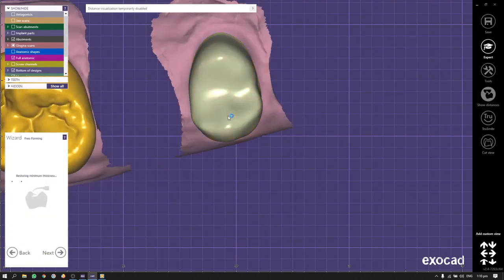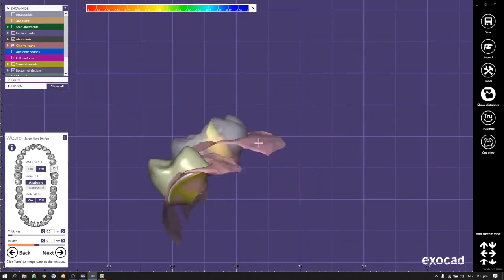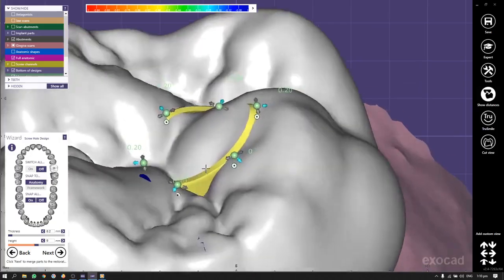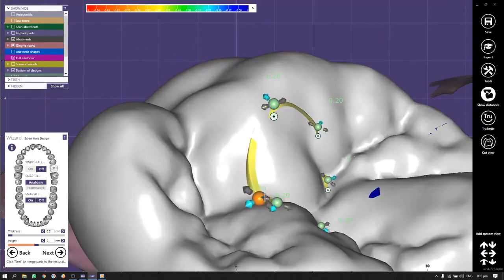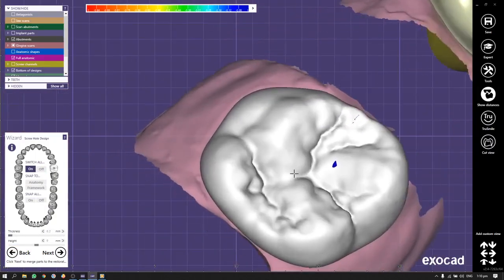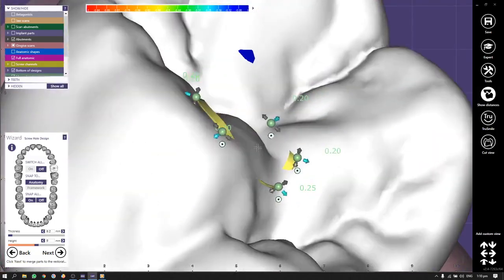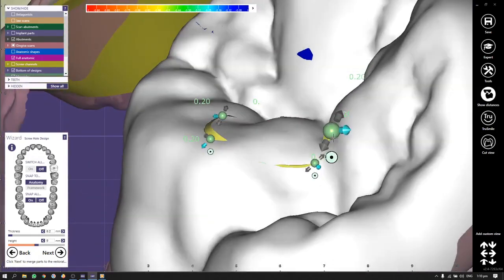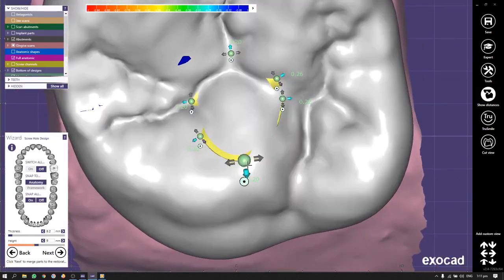That's it. We go to the step of the screw retention, where the program will make the shaft itself, the screw access hole. The shaft can be made with a slight increase, which will strengthen the edges, and during the milling there will be no cracks here. Or we can press off and it will switch off this protection edging, but I'll keep it switched on. Later, after the sintering or after the milling, we can just smooth it out gently. It takes 2 seconds, no more.